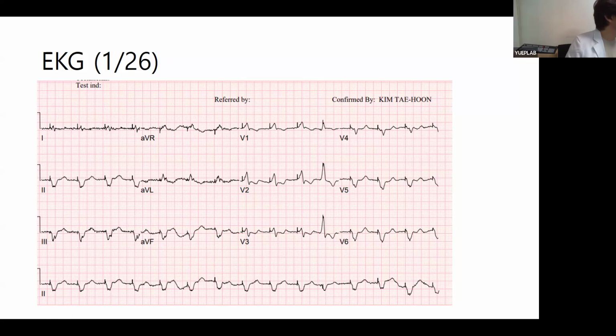Yeah, it's a usual setting in patients with AFib who are undergoing AV junctional ablation, maybe 75 beats per minute or 80 beats per minute. But we can still find PVC and non-sustained VT, so we can guess that the patient's condition is not that good. And we already know that the patient was in the CCU.